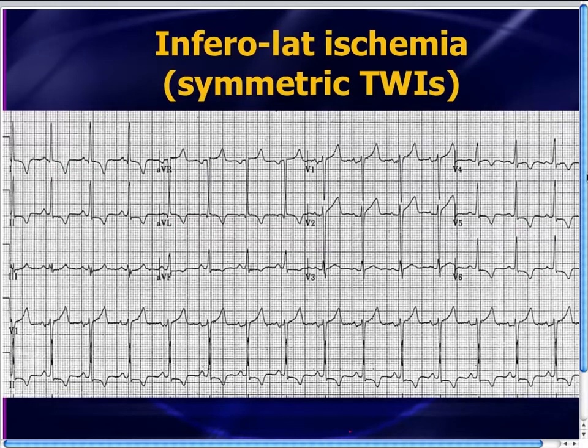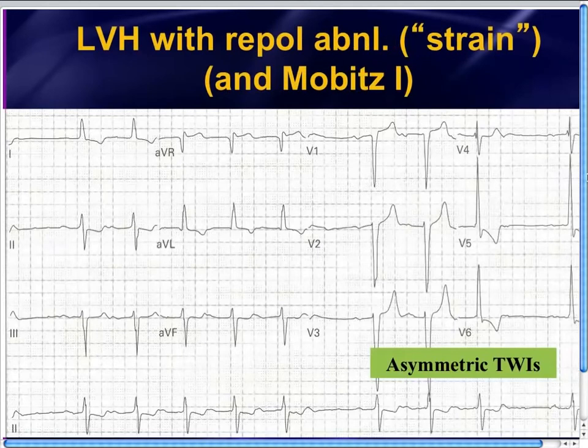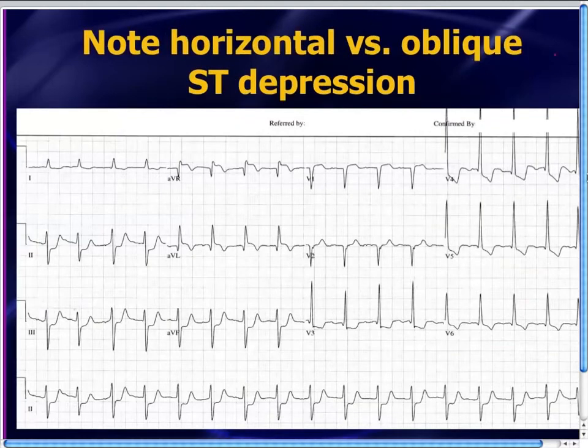This patient actually had LVH, but this patient did have a bump in troponins and had lateral wall ischemia, which resolved with treatment. All right. And for comparison, these are the nice asymmetric T waves. Again, asymmetric T waves that look like this, that is LVH with strain. But if you get T waves that are really nice and symmetric, that would make you worry. So symmetric T waves, you've got to worry more. Asymmetric T waves tend more often to be associated with just an LVH strain type of pattern.